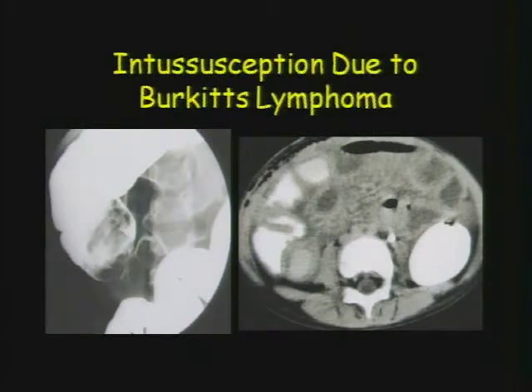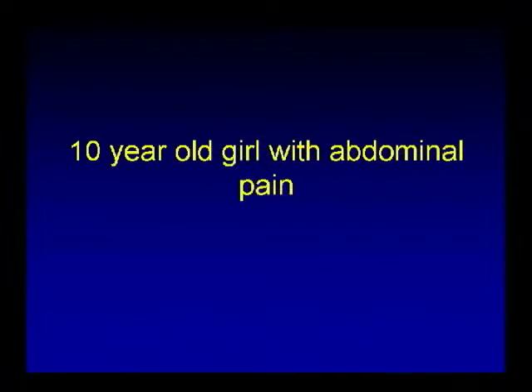Outside the idiopathic range that I told you about before, 3 months to 2 years, if you see intussusceptions, think that there's some other reason than idiopathic intussusception. Usually under 3 months of age, there's some kind of a lesion there, like a Meckel's diverticulum. Older than 2 years, think lymphoma. Very, very frequently, that's what you'll see. And here's a patient where you can see their cecal intussusception, the marked bowel wall thickening, and this was Burkitt's lymphoma.